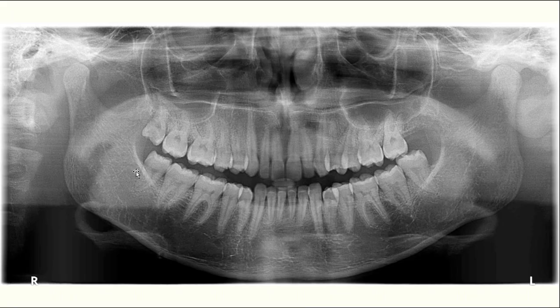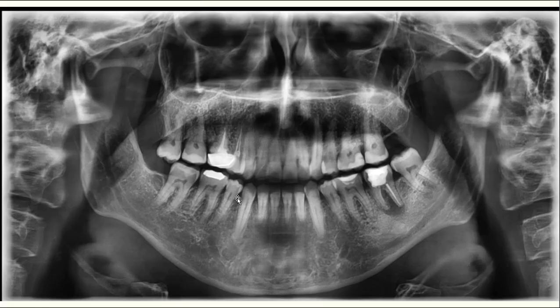For example, in this X-ray, we would call it non-diagnostic because the space between the coronoid and the condyle is wide. The shortening of the roots is the same, but there is overlapping in here, so we wouldn't call this diagnostic. Here also similar, not diagnostic.